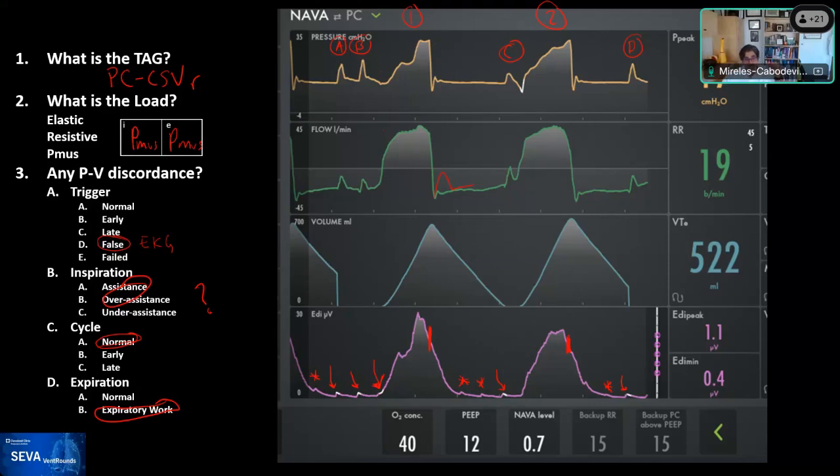We talked about assistance, and there's evidence of assistance, but the definition of over assistance and under assistance in this mode in particular is not entirely clear to me, and I don't think to many, but it's a source for us to investigate more.